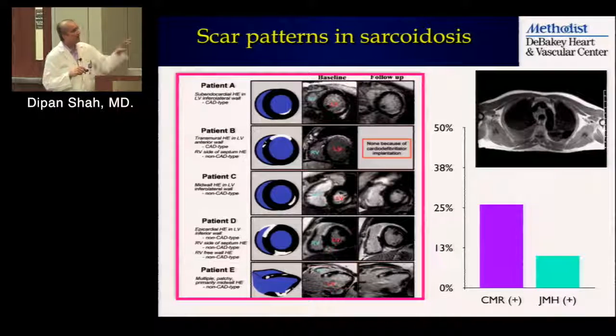Also, how do we typically come across these patients? One is somebody who's known extracardiac sarcoid. They're referred to look for cardiac involvement. The other is oftentimes a patient who just has a cardiomyopathy, and nobody's even thinking about sarcoid. But again, when we see these patterns of non-coronary enhancement, and you couple that to findings of adenopathy within the chest, right? So you can see here there's a lot of paratracheal fullness and adenopathy here, and typically for cardiomyopathy cases, we'll do a full evaluation through the chest as well.